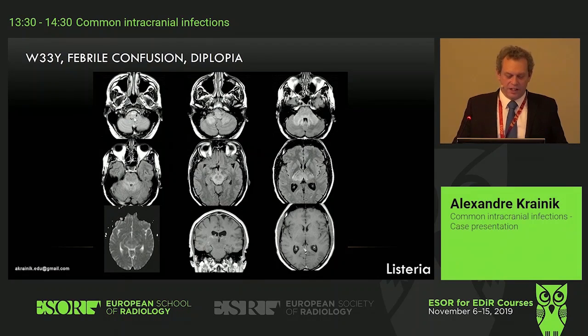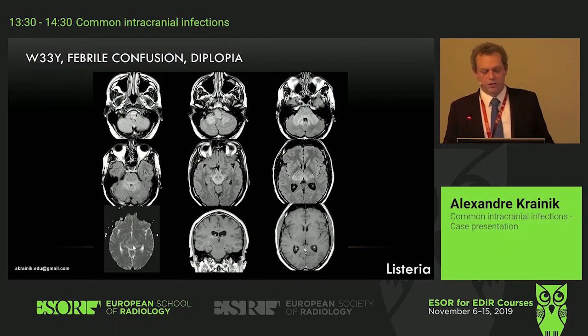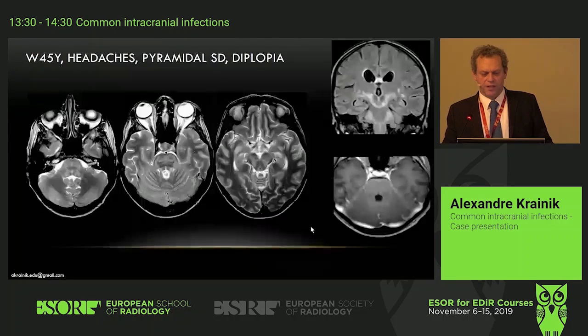Sorry about this. A different case in a patient having this pontine involvement, cerebellar involvement, bilateral cerebellar involvement, also a midbrain involvement, diencephalon. Diffusion image didn't show any particular restriction. You see on post-contrast image, there was nothing to see, and the idea was to think of listeria. Then I hope I will think back. Okay, then let's go on this one.